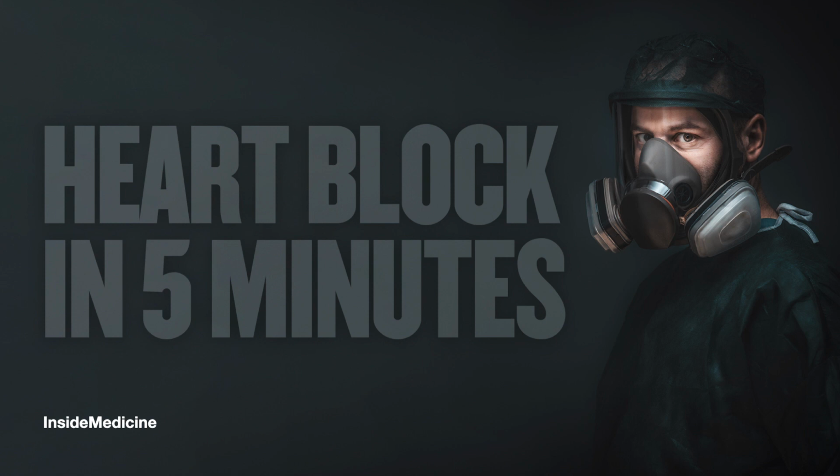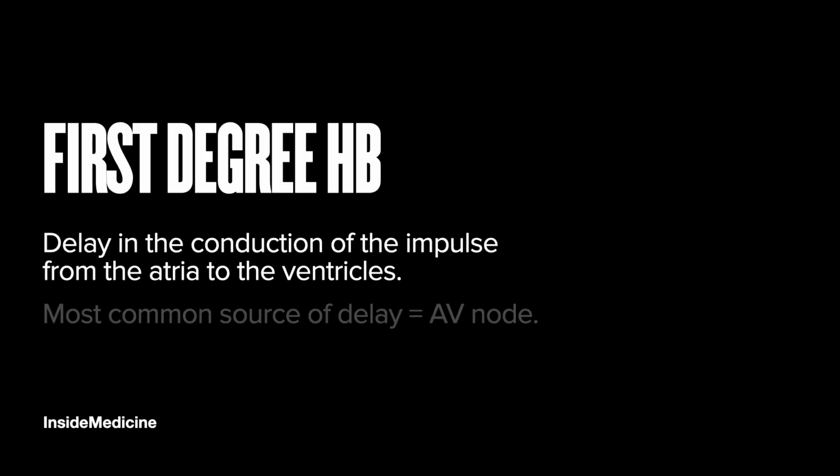How to learn heart block in 5 minutes. There are 3 main types that you need to know. In first degree heart block, it takes longer for an impulse to travel from the atria to the ventricles. Therefore, on the ECG, we see a prolonged PR interval that does not change.